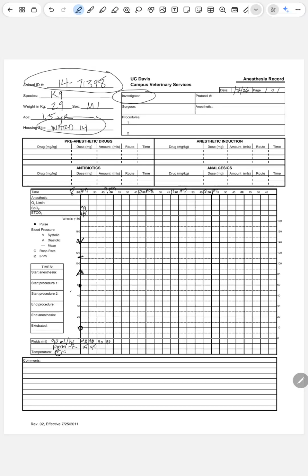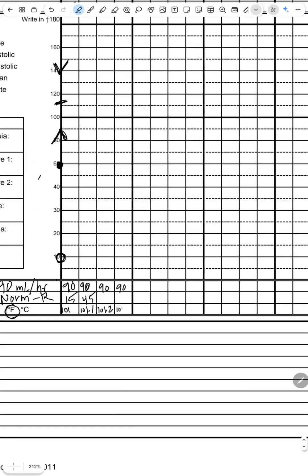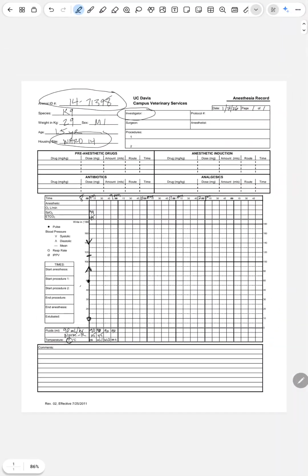It's important to, again, have that kind of written out in an SOP, and everybody on the staff is doing the same thing. And then temperature down here, same as always. You're just writing in the temp. And you can see the handwriting has to get pretty small. So if you have an electronic sheet like this, it's nice to just increase, write it in, and then you can go back down to size, and it still shows up legibly in there.